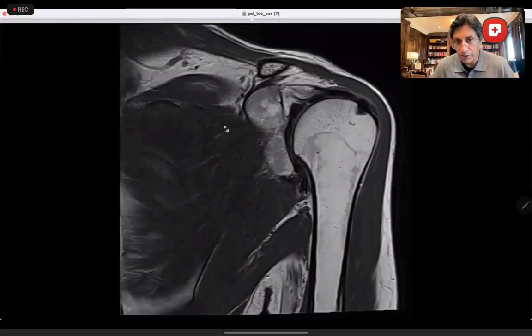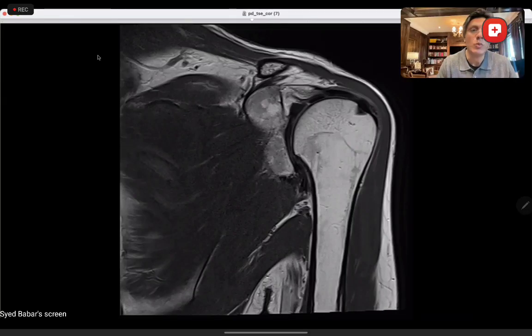And the next case that I'm going to show you, we'll do the same. In about 3 or 4 minutes, you can actually come to a nice diagnosis. These are the things you're looking at when you're doing the shoulder. So always follow the same sequence. Let's look at one more case. Let's see what case I'm going to show you. Okay, this moves a little bit.